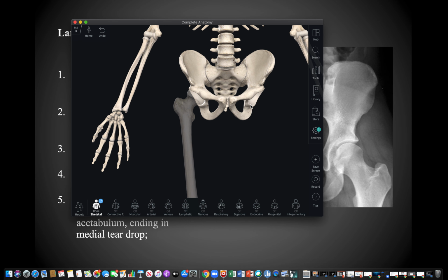Okay, so you also notice the posterior lip has this pretty significant turn in it. So it sort of comes down, it's like the Nike swoosh sign in some ways. So again, it comes down and sort of does this loop down here. And the anterior one does that to some degree too. It has kind of a slight sigmoidal appearance to it.